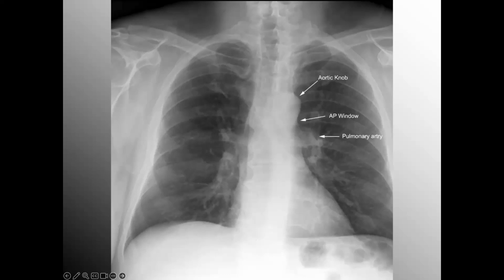Here, the aortic pulmonary window, as it's called, is shown, also known as the AP window. As well, you have the infamous aortic knob, and the left hilum is highlighted. Recall that the aorta is just like any other malleable tube under pressure, in that a patient with hypertension, particularly if it's uncontrolled or under-controlled hypertension, they're going to possibly present with slightly uncoiled aorta, causing the aortic knob to be quite prominent.